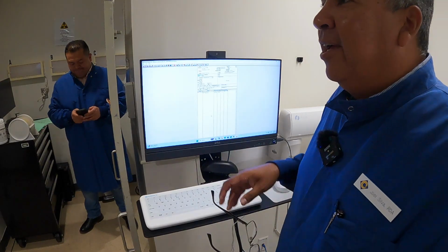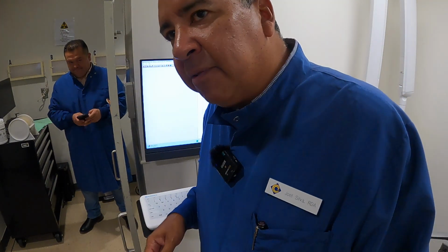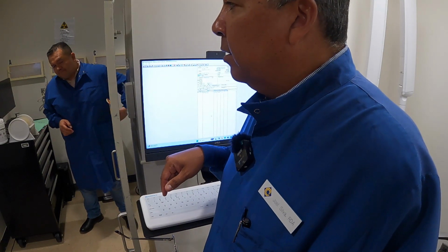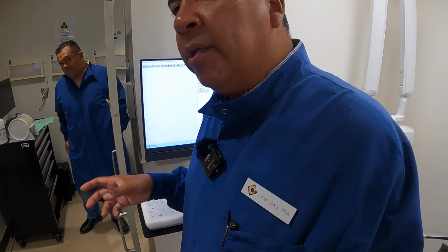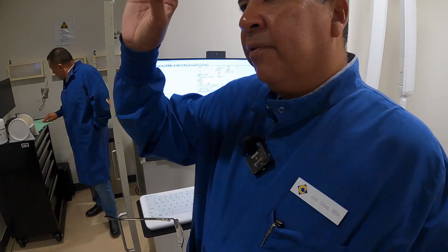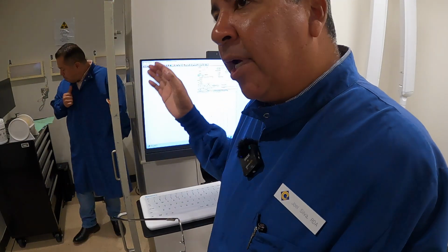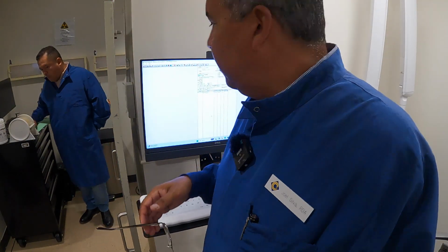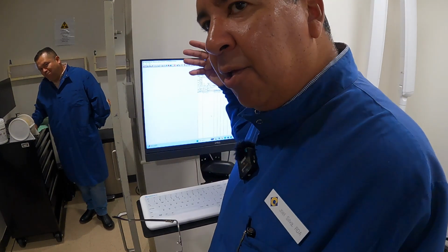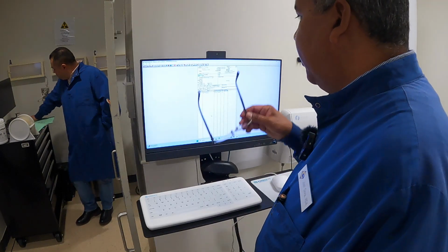Okay, so every time we do a new set, whether it's my class or you got somebody else's class for it, and we're doing this thing, the next set that we're going to be doing is a full mouth series, or FMX. You would basically put FMX for the first name, and then the technique is still the same because we've got to complete that technique, and it's bisecting. And then you'll have another kid under there, and you'll have 4 kids under there, so they'll be right under your name. Okay, are we good so far?